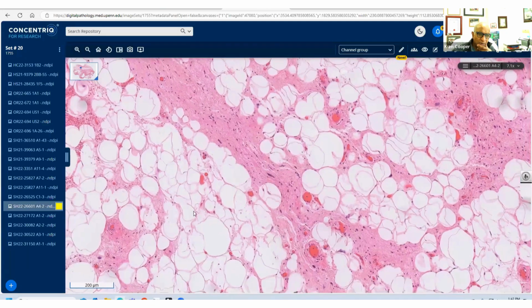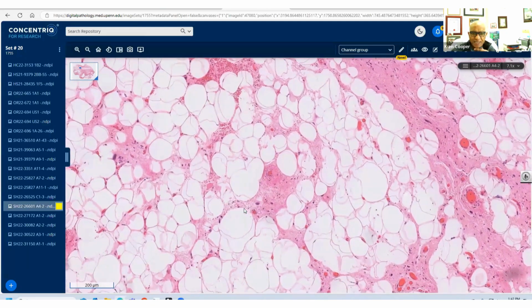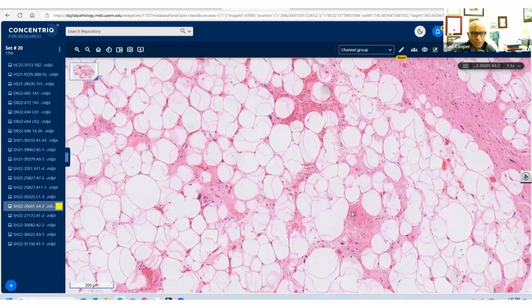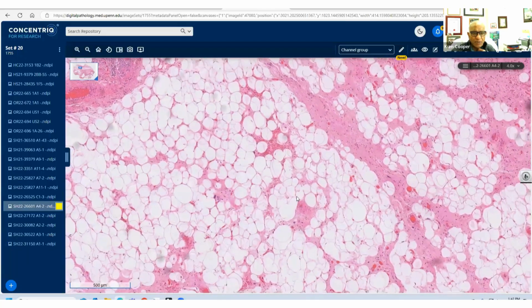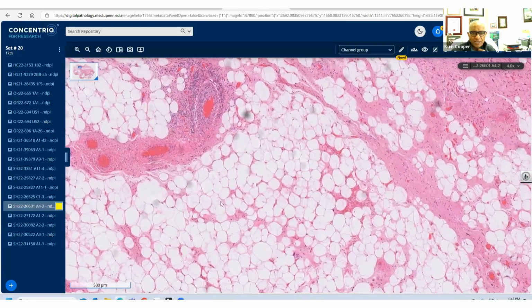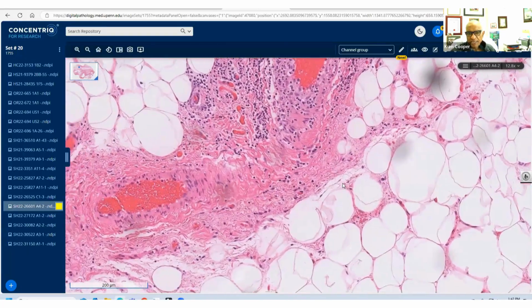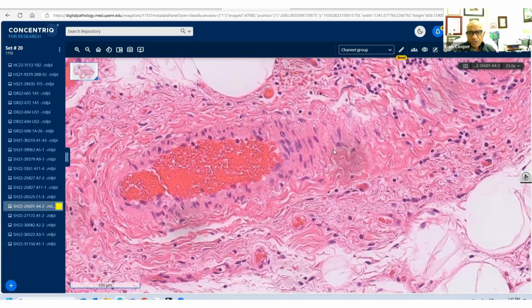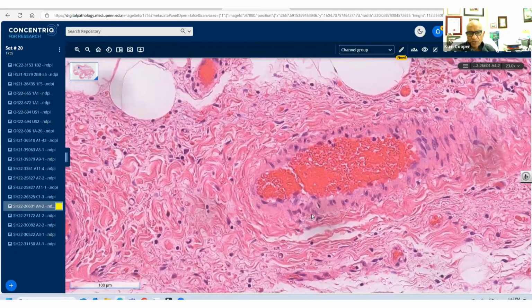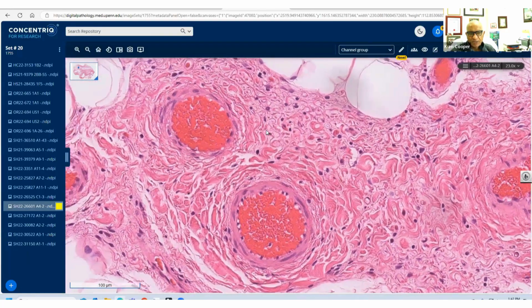However, this is in the abdomen, and because these are more difficult to excise in the abdomen, we call them well-differentiated liposarcomas. Ahmed and I were looking the other day at the books. When you look at the books, they talk about these atypical cells involving the vessels. And when you look for atypical cells, you look at the stroma, that's where you find them. But if you look at the vessels, you can find these atypical guys.